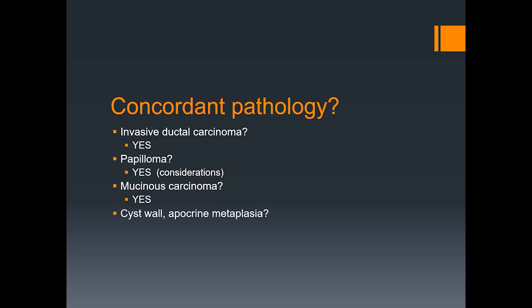Cyst wall and apocrine metaplasia. I would argue no. You would probably know this as you biopsy using ultrasound guidance, as unlikely. If this was a cyst, it would probably decompress. Many of the features, though, under ultrasound and under our diagnostic mammography, didn't support a cyst wall, and we might consider that we weren't accurate in our biopsy samples as we harken back to the actual biopsy procedure. And so again, throughout the process, we think about RAD-path concordance.